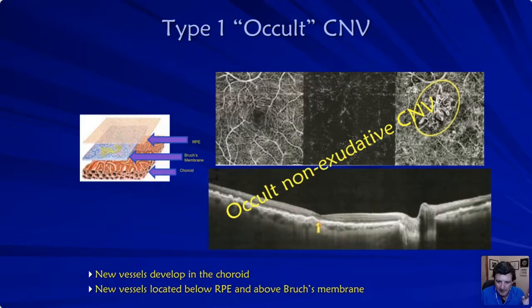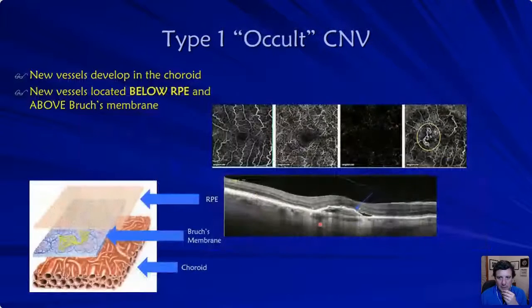There's a net right here. It's right there, right below, right where those photoreceptors are, and it bleeds, and the vision dropped. The 4th, the 5th, we've been injecting in the practice. I'm not saying that's what your retinologist is going to do, but we had this kind of heart-to-heart talk: why not, till we figure it out? Your first 3 or 4 bled. Let's do the next 3 or 4, and we're saving vision because we're picking up on these early choroidal neovascular membranes.